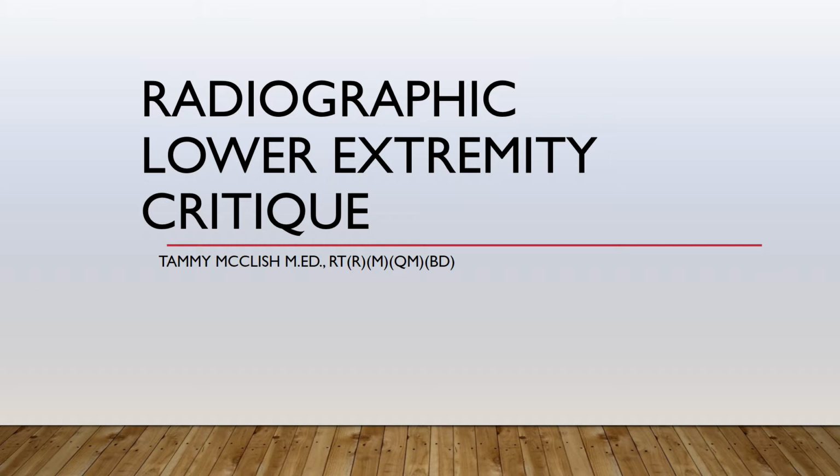Let's take a look at radiographic critique of lower extremity.